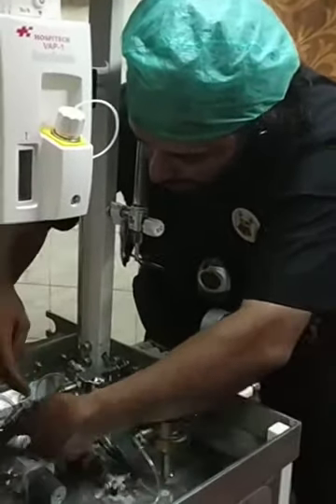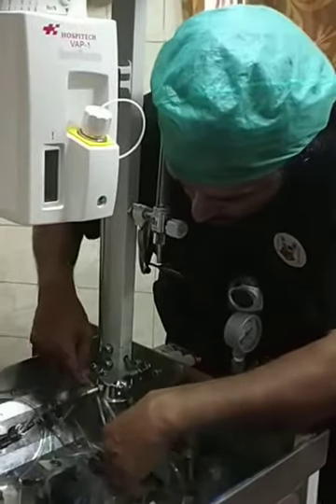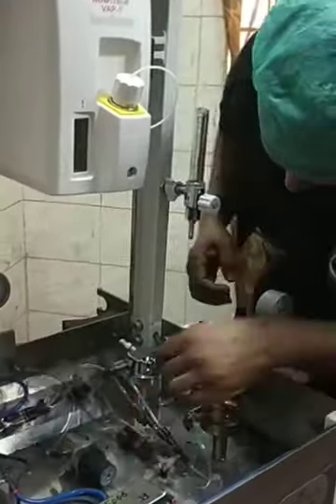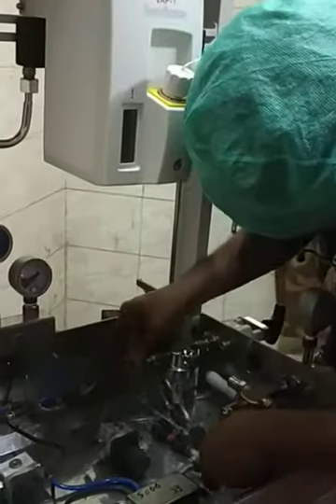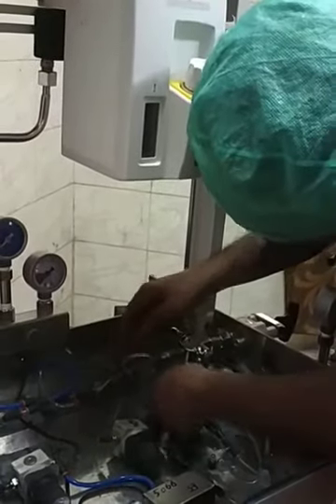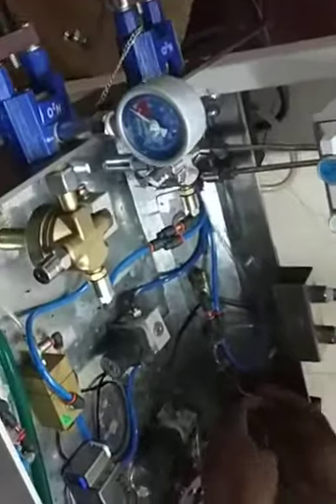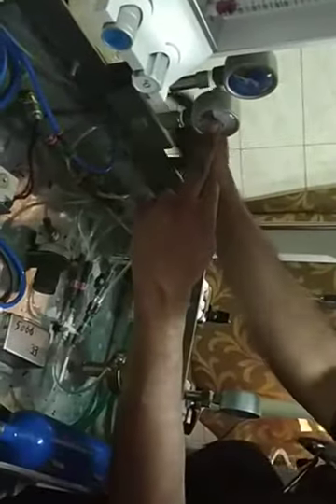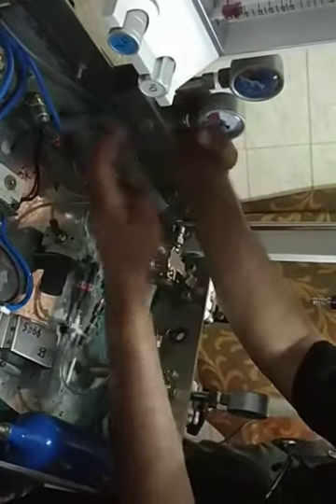Then this is going, one minute, like this. It comes here, this is the hypoxic alarm, this goes here, this is going here. Now if you see, this is going here, this helps me to understand at what pressure it is coming in, what is the level of oxygen in the cylinder. We have that over here. This helps me to understand again the pressure over here, because I have a provision for a pipe supply also over here.